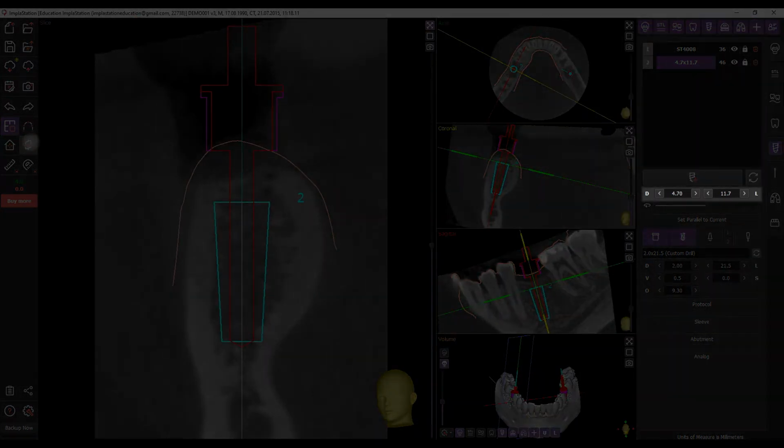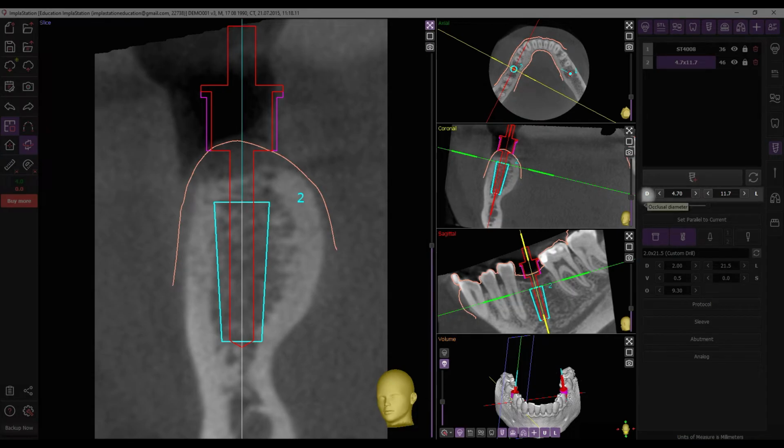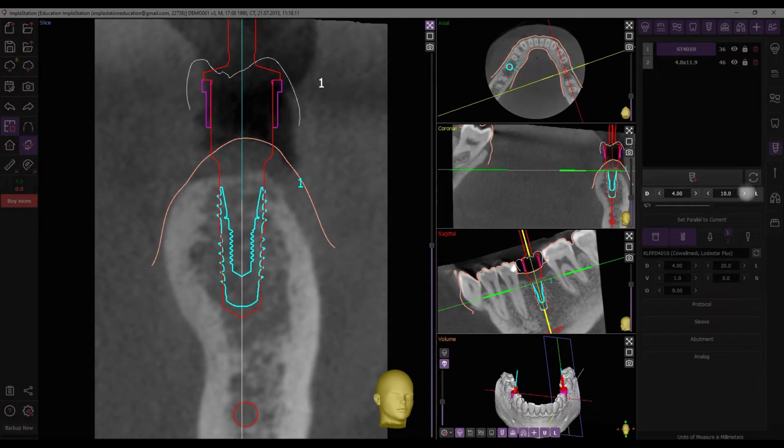Let's start with the quick size adjustment elements, located here below the implant placement buttons. Without interrupting the planning process, you can change the occlusal diameter and implant length values by toggling with the arrows. Custom implant size changes will occur in increments of 1/10 millimeters. Library implant automatically switches to the next implant in the library list. After modification, the program will automatically suggest the corresponding drilling protocol, master drill, and guide sleeve considering the updated parameters.